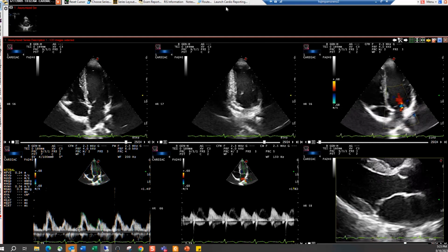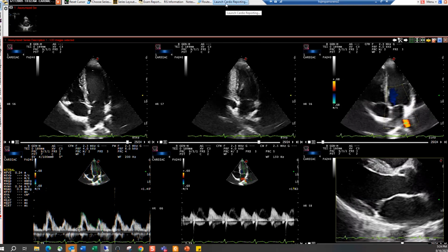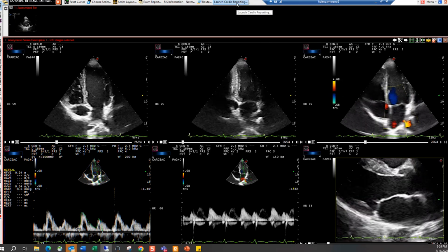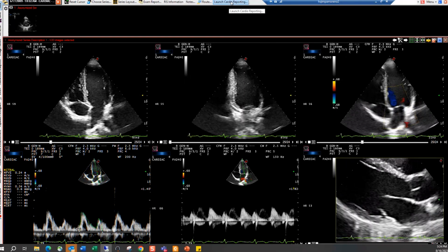So Dr. Scott, if I click on this, this is that button we were talking about earlier. This is what the structured report will send the measurements to Encapture MD by pressing this button, and it'll launch the reporting tool from there.